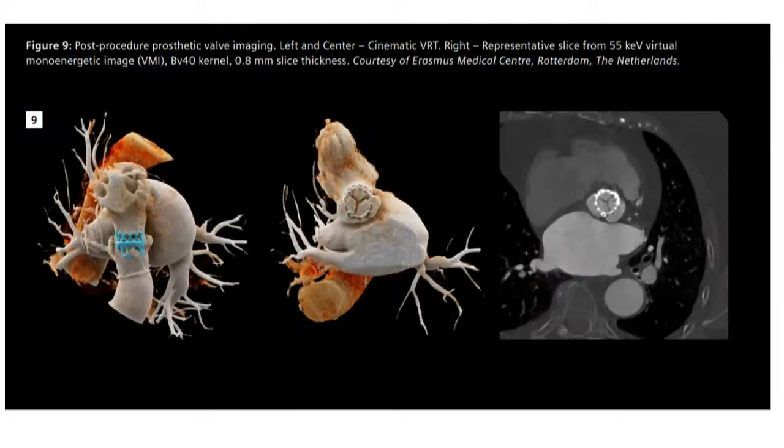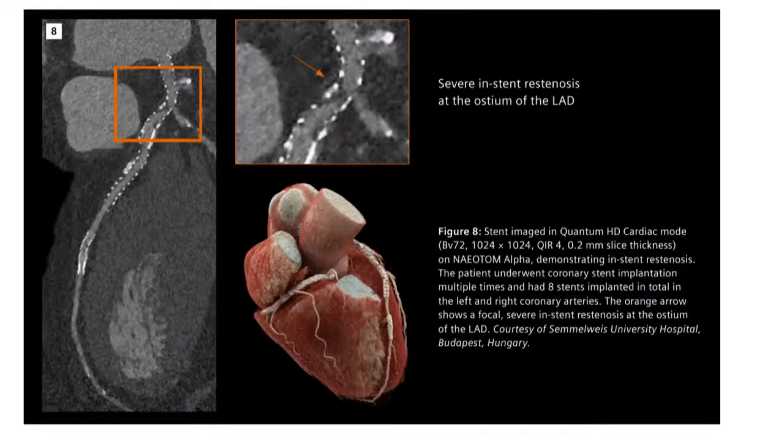And so we want to look beyond the coronary, right? I mean, it can be used for imaging prosthesis, in a sense, very high calcium, very high Hounsfield unit, and for stent. For large stent, you can have this degree of accuracy, okay?